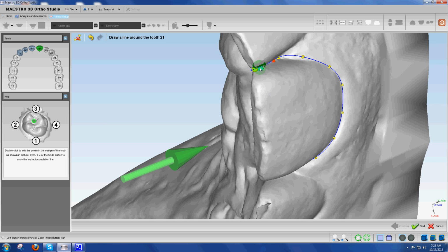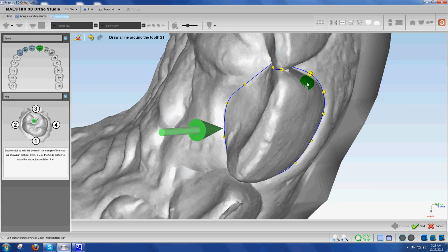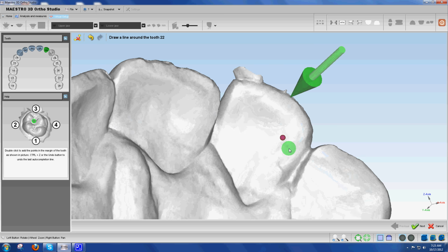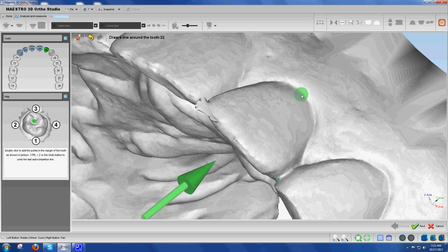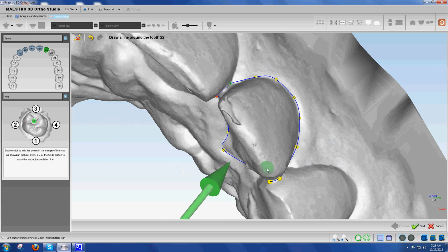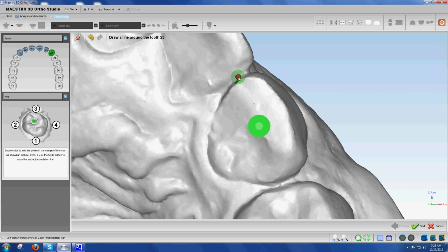This looks also pretty good. Now, one needs to be mindful of the spline line not twisting up unnecessarily. So here's 1, 2, 3, flip it around, 4, and that got pretty much nailed. And I'm going to accept that, going for the canine.